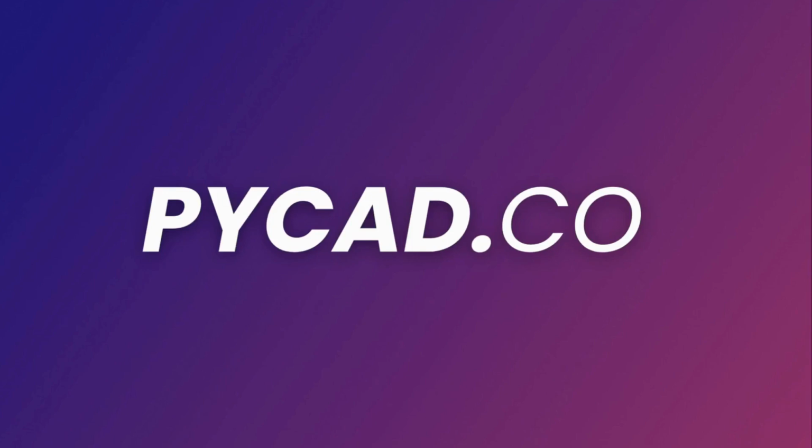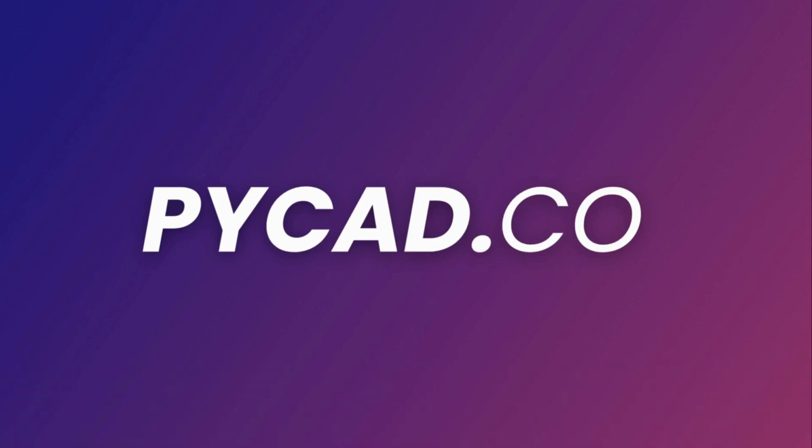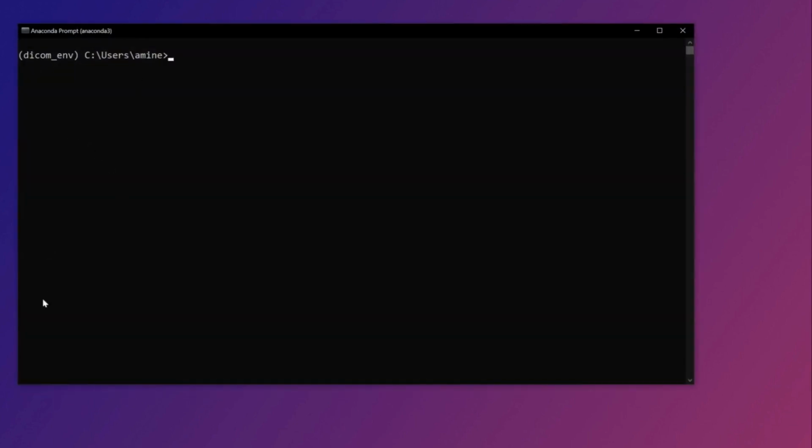Now in this video, we are going to install the Python packages that we'll use for the project. As you know, all the packages for DICOM, NIfTI and so on are not installed by default with Python. So you always need to install these libraries independently and then use them in your code. To do so, let's go to our Conda prompt, which we installed in the previous video for Anaconda. But if you are using a virtual environment, you can open your command window and activate your virtual environment, and then we do the same thing that we are going to do now.